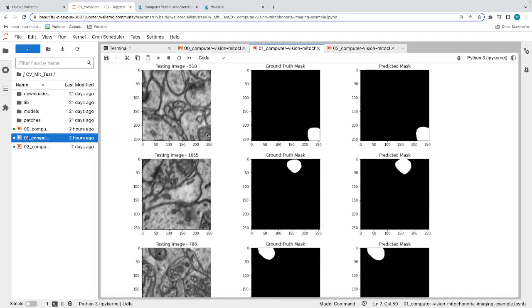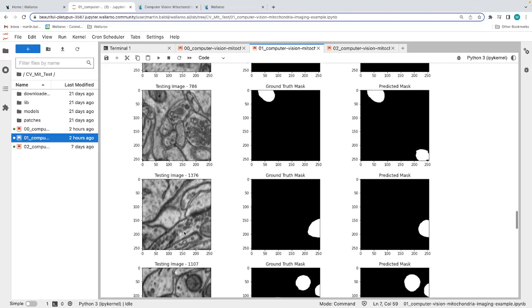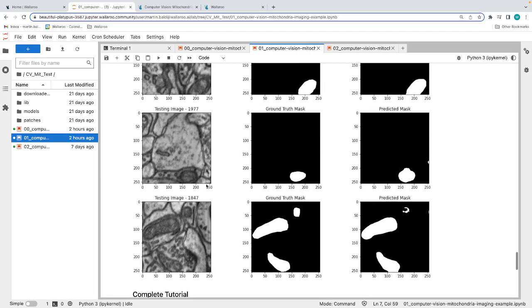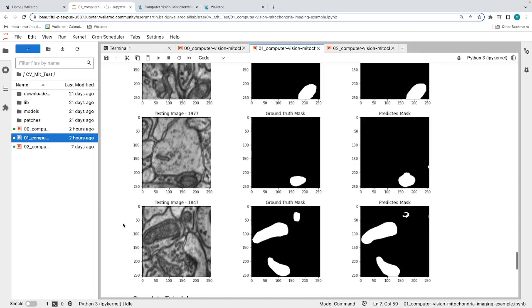We can see here in the bottom right hand corner of the first image that it's reflected here, and our prediction says that this is mitochondria. As we go through these images, we can see that it is detecting our mitochondria in a number of these cases. As I talked about at the beginning, the benefit of this in the health space is to quickly identify certain cells and certain conditions, which could be cancer cells, or other things like blood clots, that the health staff need to be aware of and diagnose very quickly.